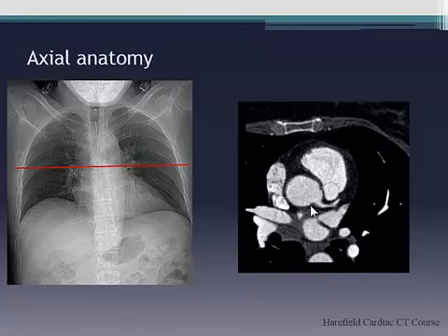So you line up with the aortic valve, and then it becomes much easier to identify the appropriate cusps, and then to identify the appropriate sinuses, and then to identify whether it's normal coronary anatomy or not. It can be a bit tricky sometimes off the axial, but you'll get used to looking at it from the axial. So for those of you who do MR, it's quite helpful because it saves you having to load it into a workstation to look at it on 3D.